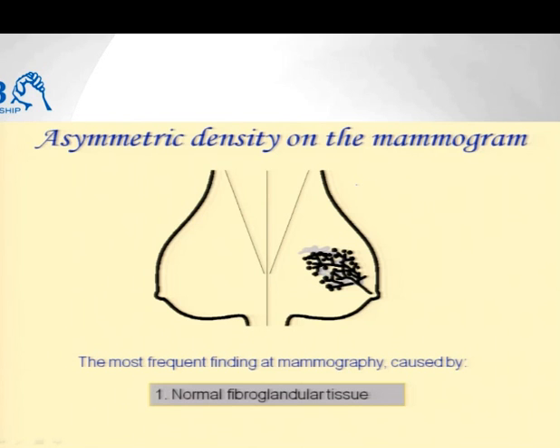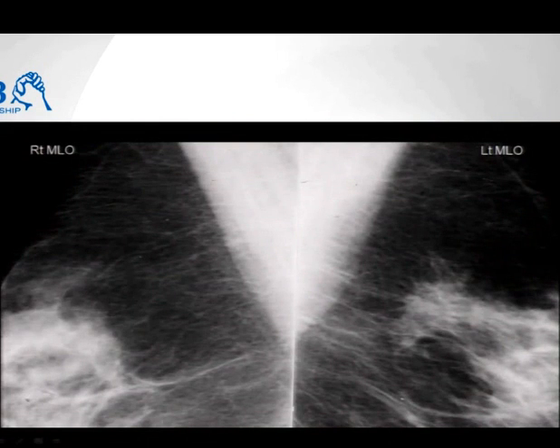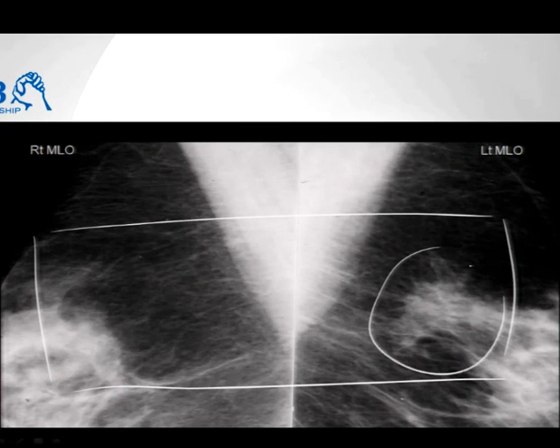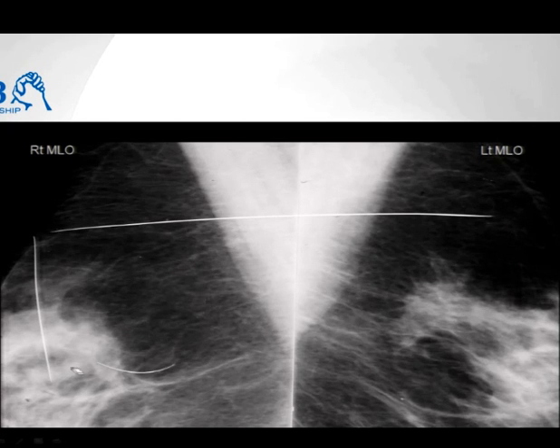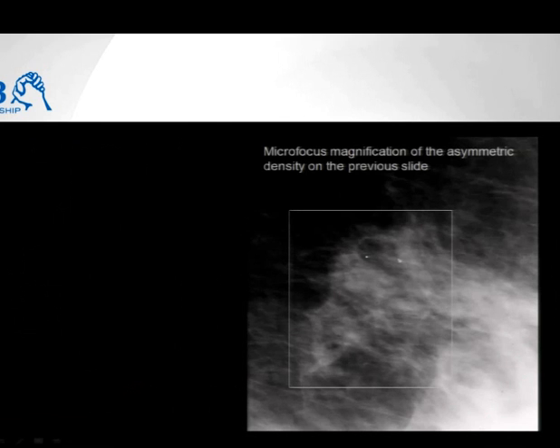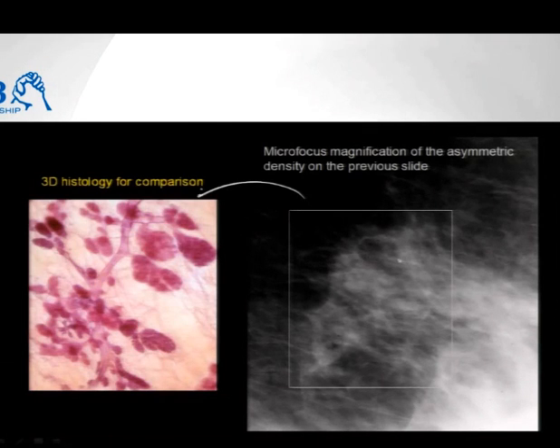So just as a very quick introduction, let's look at how you analyze asymmetric density. There is an asymmetric density because this one is missing from here. And now I'm going to analyze it by looking at the digital mammogram, magnified picture, and I always think in color. So I'm saying, is there any TDLU? Yes. Different sizes? Yes. The smaller could be this one, the larger could be this one. So I got one basic building block.